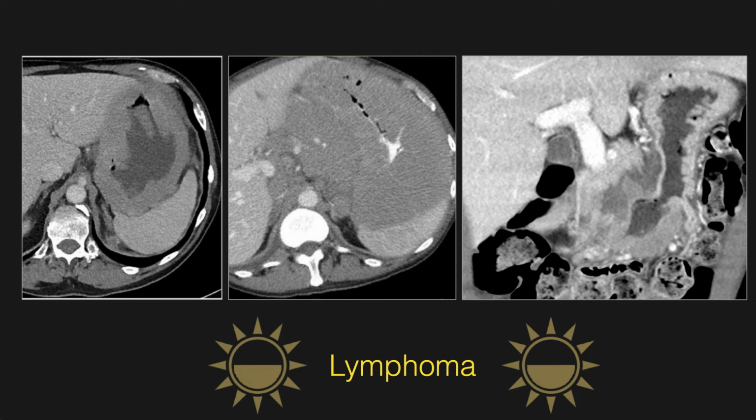Gastric lymphoma can result in varying thickness of the gastric wall and can even get quite bulky, as in the second example. In keeping with the old adage, it does in fact usually not obstruct. This is due in part to the impact on the myenteric plexus of the wall of the bowel, resulting in a common cavitary appearance despite the presence of bulky disease.